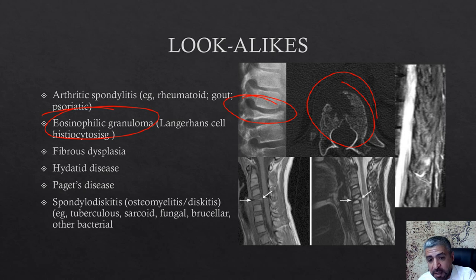and in the MRI you can see all the vertebrae look quite good. There's nothing wrong with them, just one completely collapsed vertebra. It is very suggestive of vertebra plana. However, other diagnoses like metastasis, for example, cannot be excluded, so you have to keep that in mind.